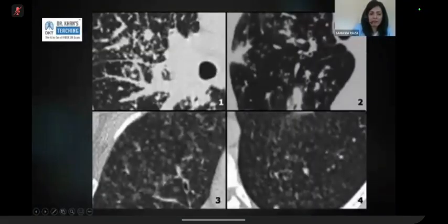Then you look at the bronchovascular bundle and it's slightly beaded, slightly irregular. So you have fissural nodularity and bronchovascular nodularity. That's a very specific diagnosis to make. If you have calcified or enlarged lymph nodes, you can very confidently call this sarcoidosis. And that is what it will be 90 out of 100 times.